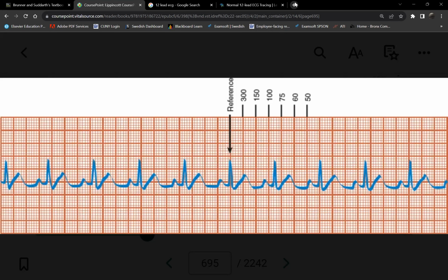If I were to pick, I would choose this R or this R. Why would I choose these two? Because they look the same. Because they fall on a straight line. So it's easy for me. If I count between these two, can I count the small boxes or big boxes? Very easy. So how many small boxes between these two? 5, 10, 15, 16, 17. It's not really 17 because it's somewhere in the middle. It's more like 17 and a half, correct? Okay, so 17 and a half small boxes.